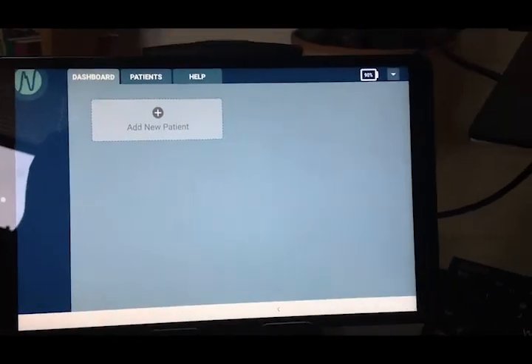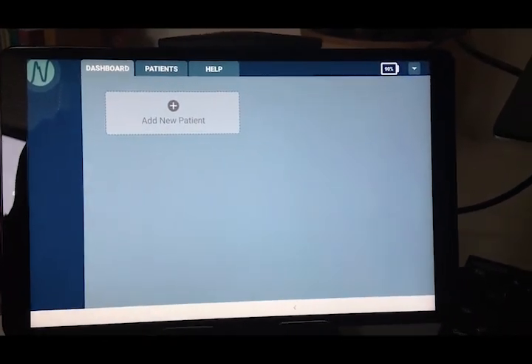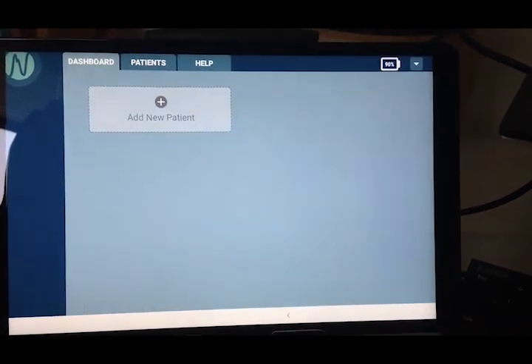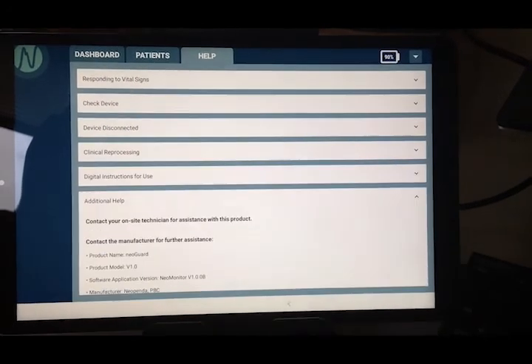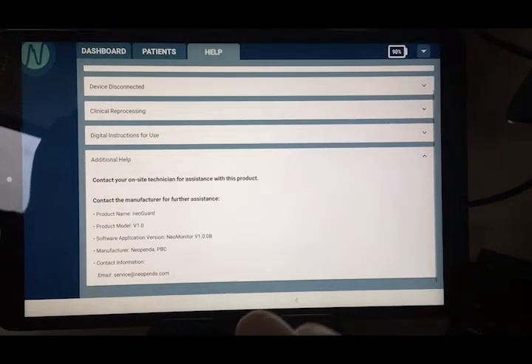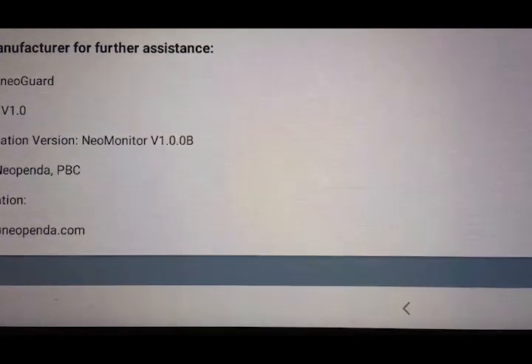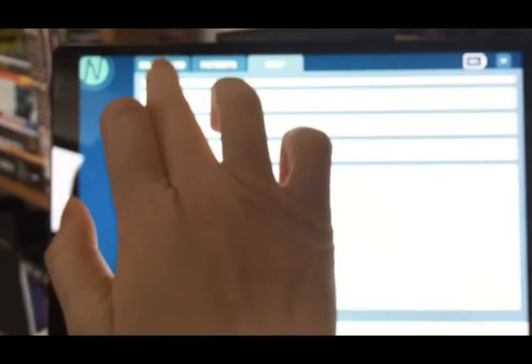We can no longer leave the app without going into system settings and entering the long unlock password. So now we are ready to use this app. Let's double check the version number again to make sure it's been updated from V100A, which is where we started, and now we're at V100B, and we are ready to use this locked app with a customer.